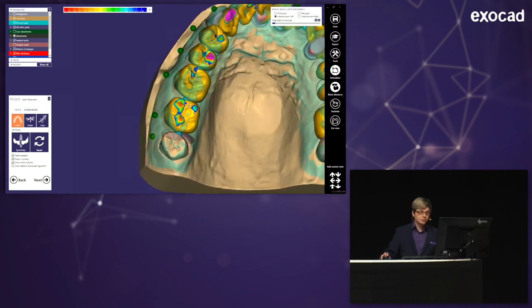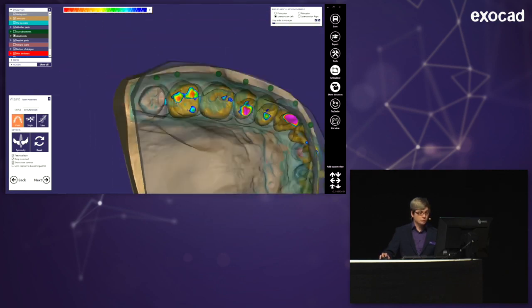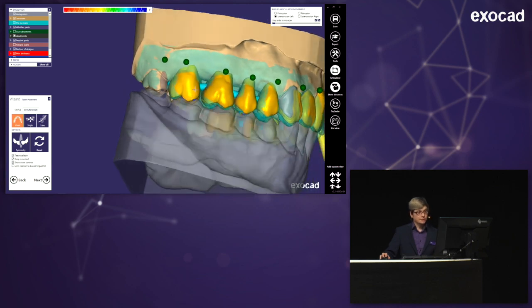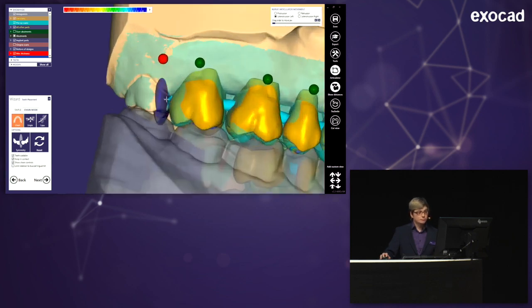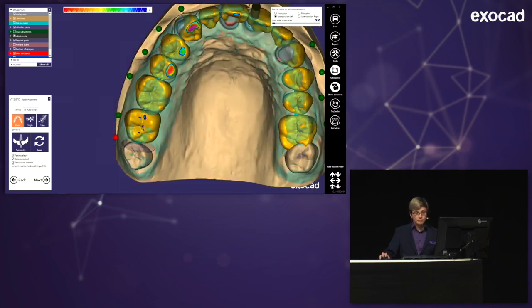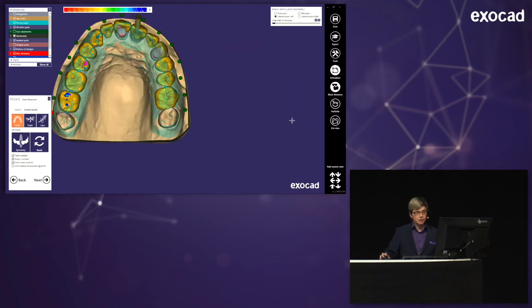And the trick is to first just place one of the molars. I'm just taking this one here, and placing it where I want it to be, and ignore all the other teeth for that. Then I deactivate the movement of this disc here. And now I place the other molar, and you see it works in a chain. They never lose their contacts to each other.